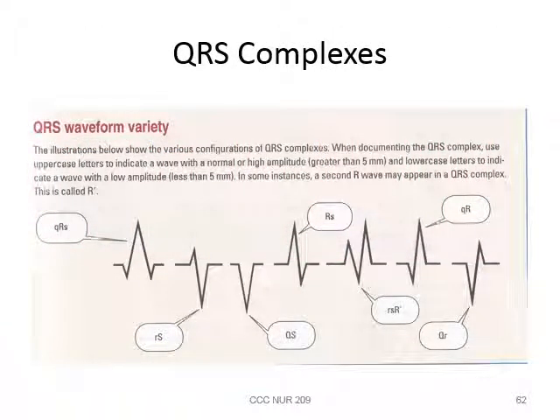Okay. Now, our Q waves can be different shapes, so don't you get bent out of shape because the Q waves are different shapes. Just call these QRS complexes. There are different determinations that we use when we're looking at cardiology type terminology. This is a QRS, this is an RS, this is a QS, this is an RS, this is an RS prime, then a QR and a QR. So don't worry about it. The main thing is look at it. Is it consistent throughout the strip? What's the width of it? Is there a Q wave for each PR, each P?